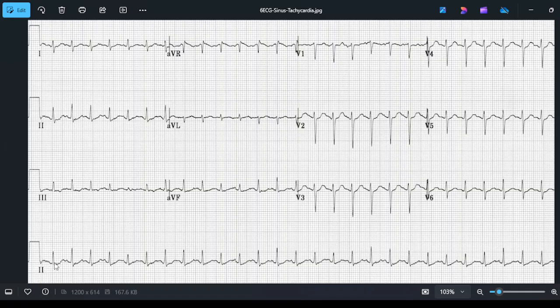Don't get confused. Whenever you go to the bottom line, you need to see the entire strip that runs from one end of the ECG to the other end, and in that you will check the RR interval. If the RR interval is constant, that means this is normal rhythm or tachycardia, that is, sinus tachycardia. So this is about sinus tachycardia.